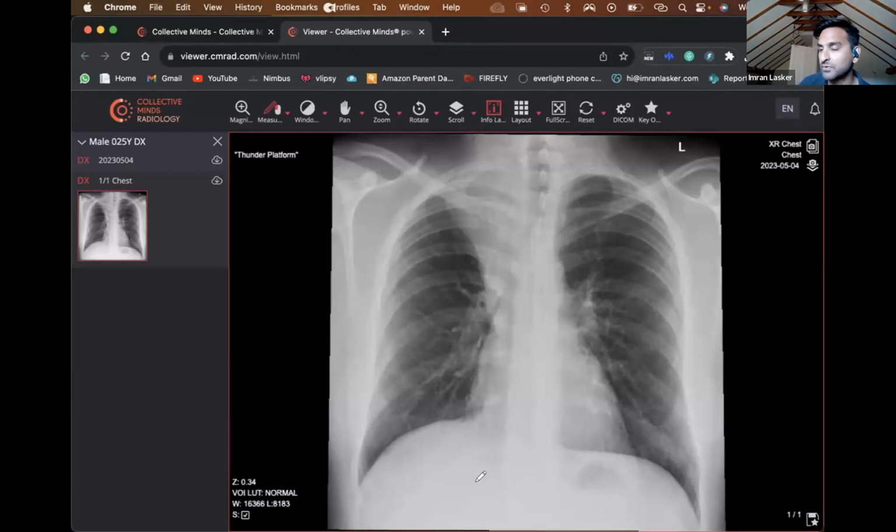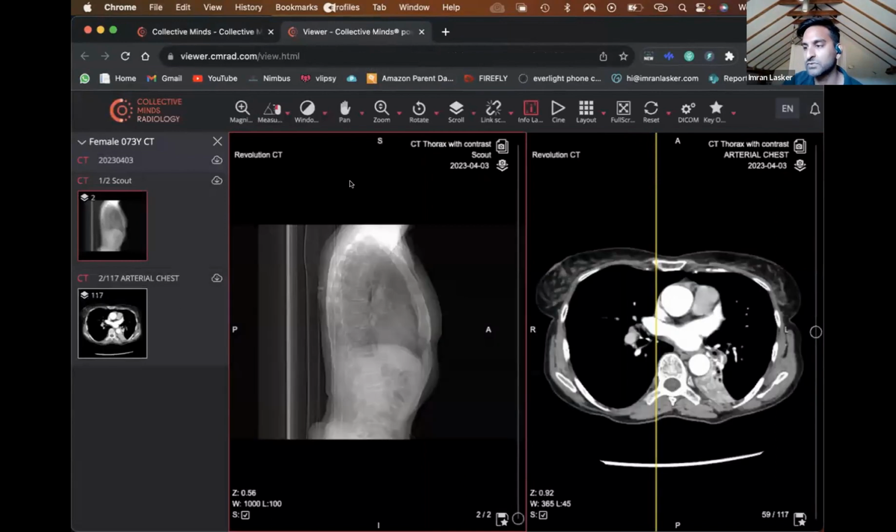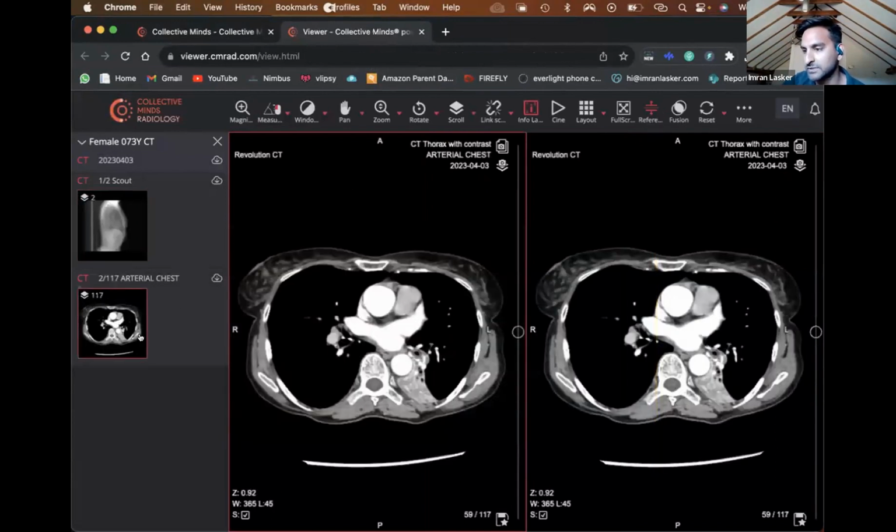So it's very, very important to have these check areas, because even if it looks normal in the beginning, sometimes you go through the check areas and something pops up, and you think, oh yeah, good thing I had those check areas in the first place. For those that are learning, I would highly recommend that you get some check areas going whenever you're doing any sort of reporting.